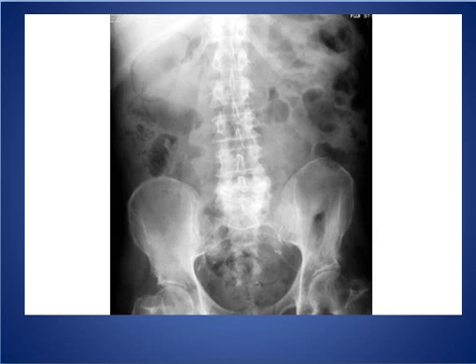The first case is a patient presented with right upper quadrant pain radiating to the back. And here, this is the abdominal X-ray of the patient. What is the finding? As we see here, in the right upper quadrant, there is a curvilinear radiolucent line surrounding the gallbladder region.